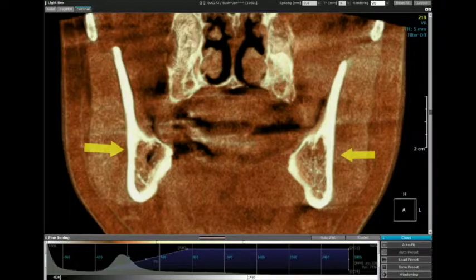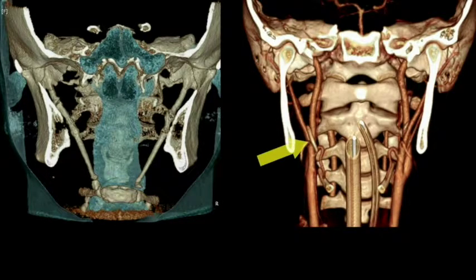I am not going to solve your problems. I wish I could, okay? I can make sexy images, all right? This is a 3D slab rendering. You can see there's calcified, elongated stylohyoid ligaments right down to the hyoid. No symptoms. But if they go, guess what this is?